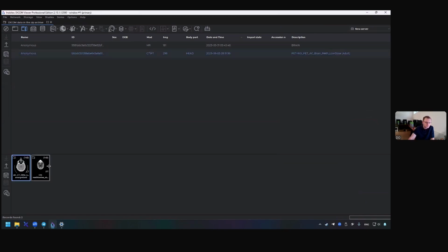Here we have the studies: CT study, PET-CT with methionine enhancement, and MRI. PET-CT scan. Here we have the CT series and the series after methionine intake. This is one series, so these are two already co-registered, aligned series.